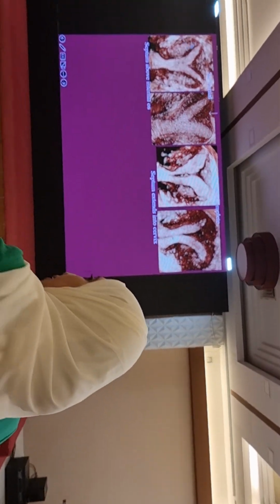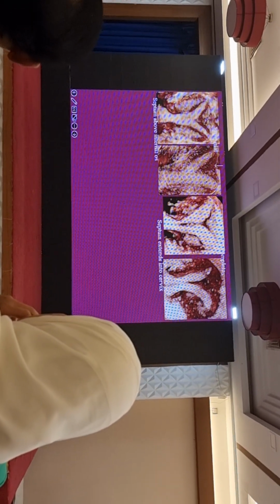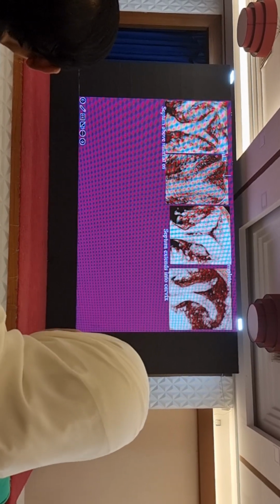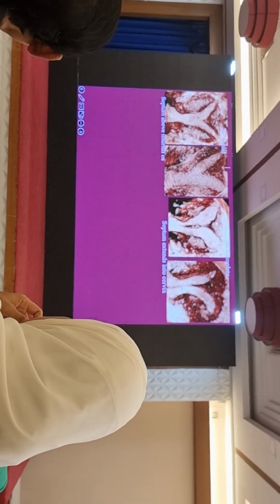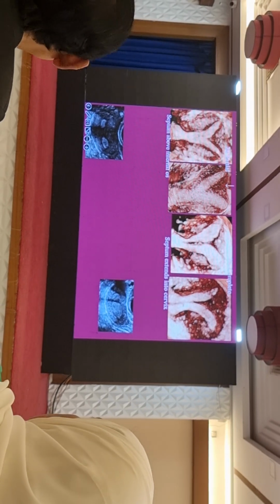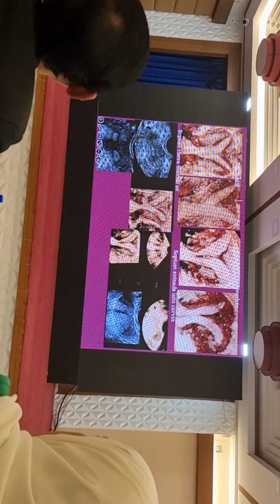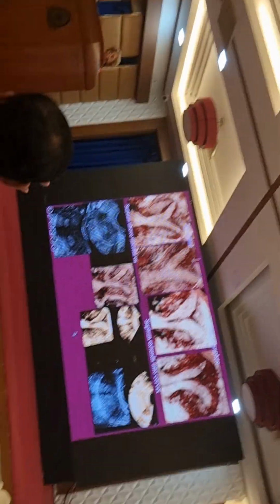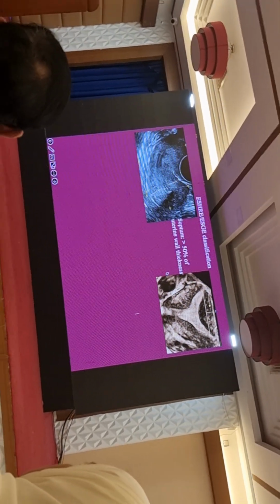Now, when we are trying to diagnose them, we look for the fundal contour, which should be normal convex, or a minimal indentation, which is considered normal. There are two endometrial cavities, and there are two interstitial segments of the fallopian tubes. On 2D, on the transverse views, is when we first start suspecting, and when we do a coronal plane, it gives us a complete septate uterus. This is another example of a complete septate uterus.